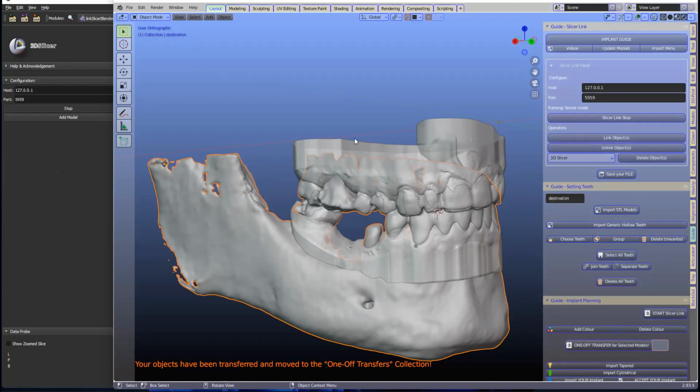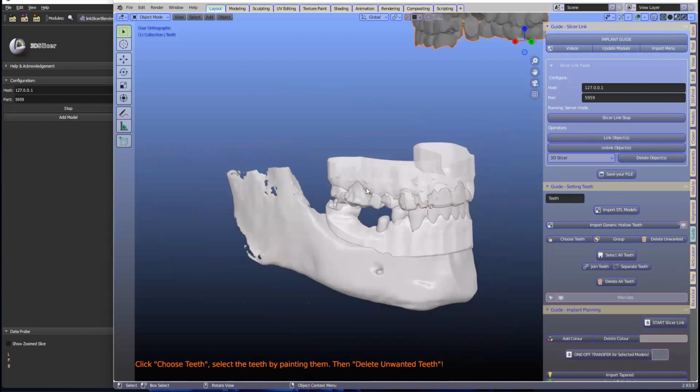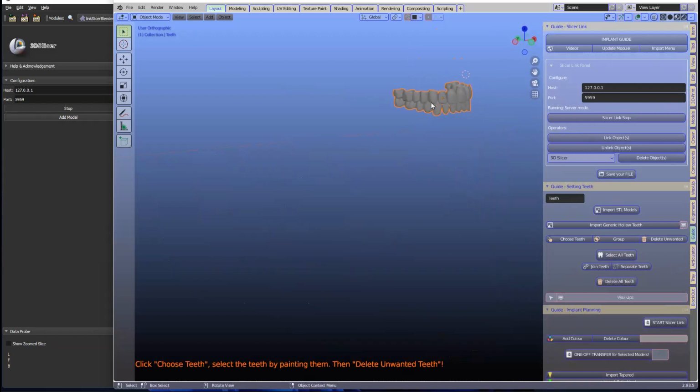All right, we need a few teeth. And also, we don't really need this top model, so we can discard that, because there's no real point to having it. Or if you want to keep it, you also can export it, and then if ever you want to bring it in, import it again at those coordinates. Okay, so we need to have two or three teeth. So we're looking at these over here.